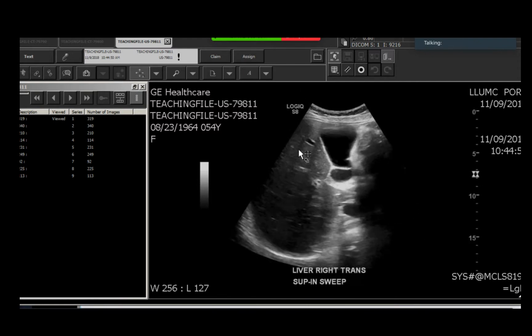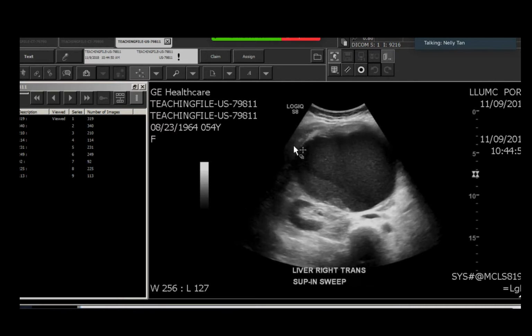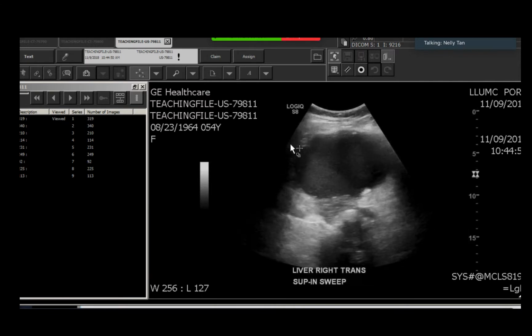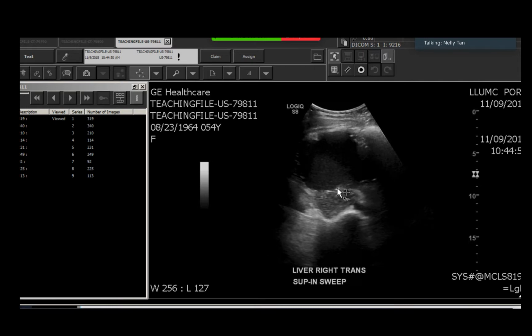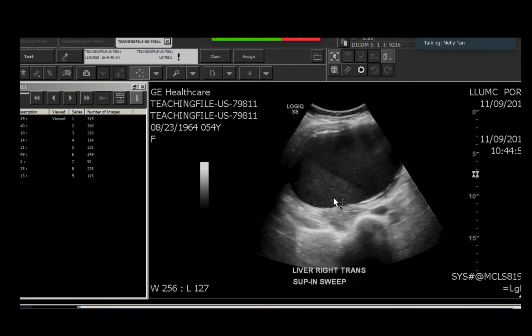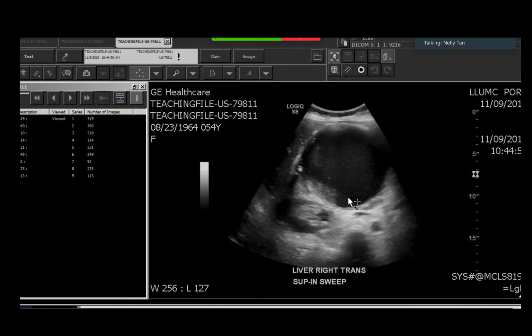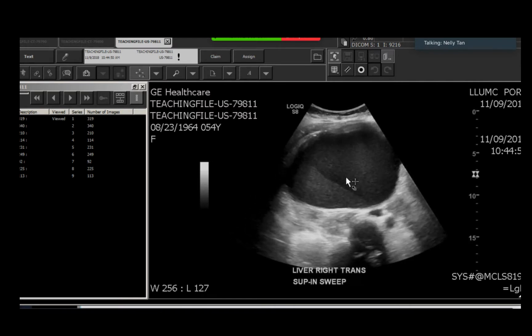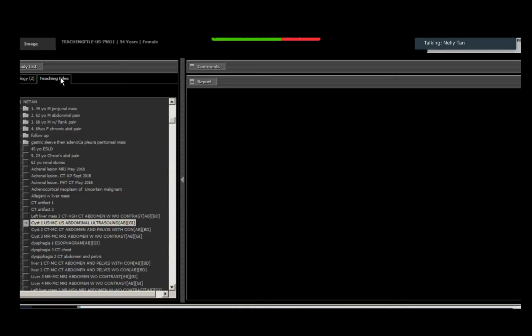Let's see. So there's this complex cystic mass in the right abdomen with layering echogenicity. And there's these punctate echogenic foci along the edges. There was no flow inside it, or nothing that we can appreciate. But ultrasound has a very limited field of view, so anything that's large should really get additional cross-sectional imaging.